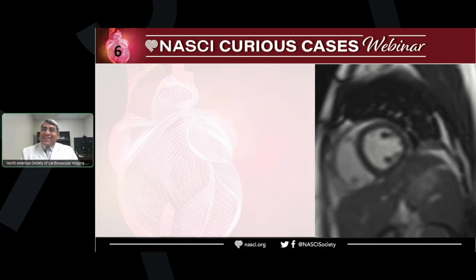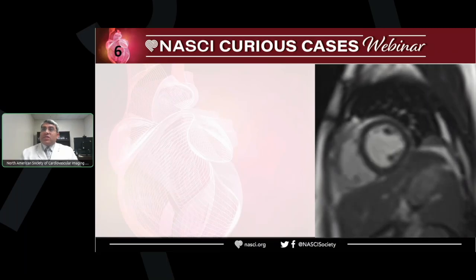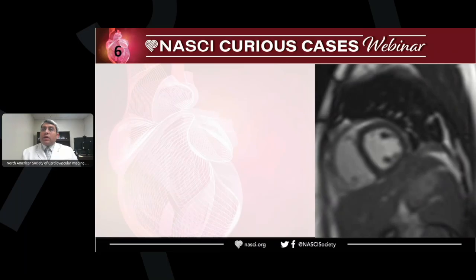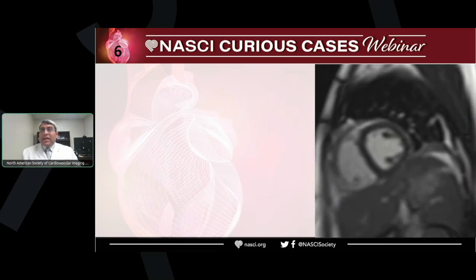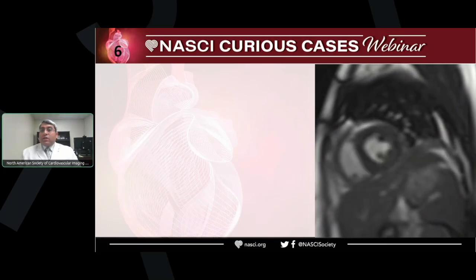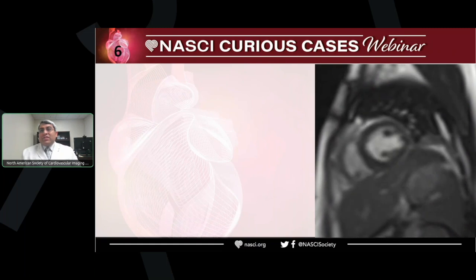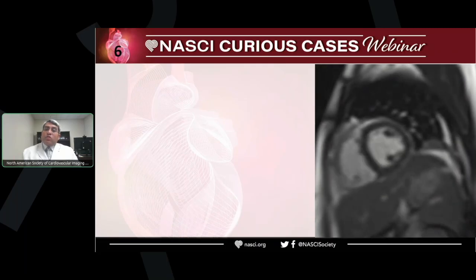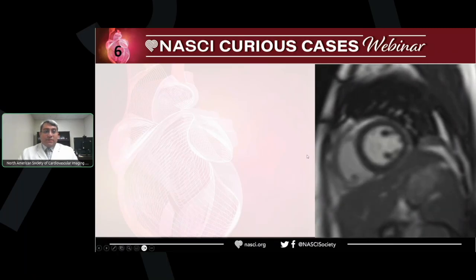Exactly. We have been seeing this in patients with constrictive pericarditis for a long time. We see thickened pericardium, but in this patient, there is still inflammation of the pericardium, still active pericarditis, and the pericardium has minimal thickening. In the CT, there is no much thickening and calcification. So this is a new entity we start to see, patients with pericarditis and constrictive physiology, but not definite constrictive pericarditis.